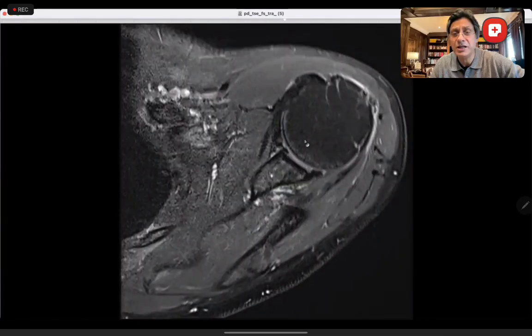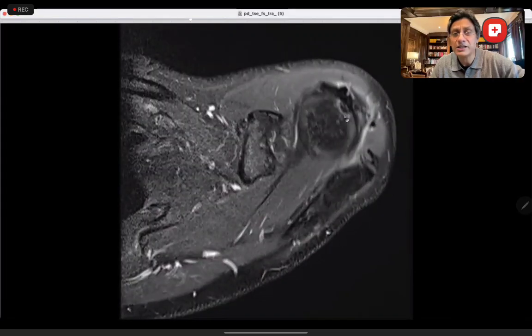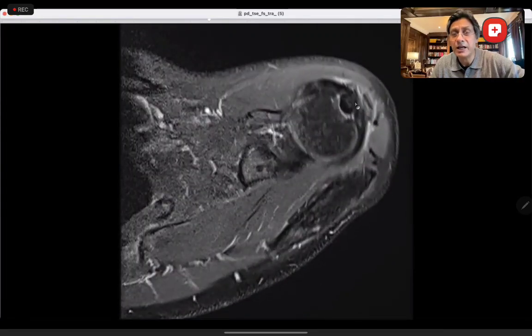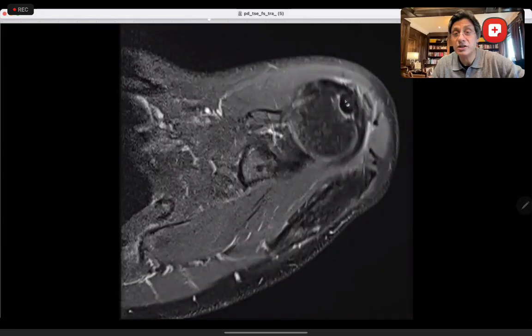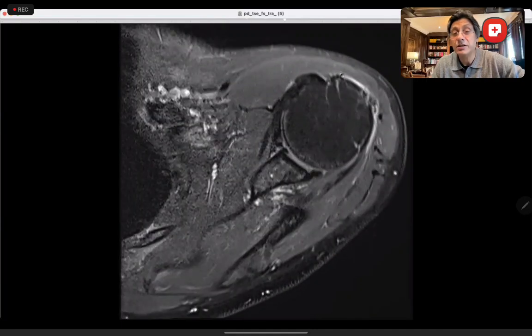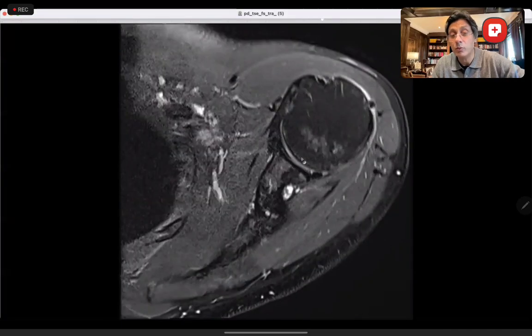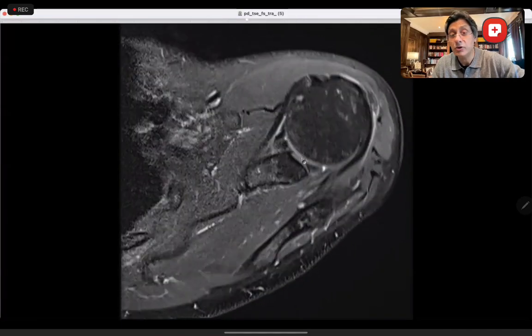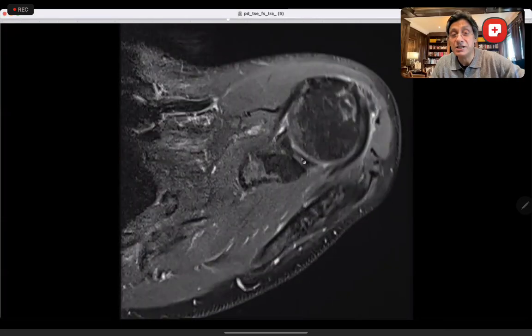The orientation is well maintained. How does the shape of the humeral head look like? So if you look at the top, nice and black, except for this flattened sort of black area. Remember, this is calcification which has gone into the bone. So it's eroded into the bone. So this is the only thing that we picked up. This is the calcification. These are calcific foci in the tendon. But otherwise, the things that we looked at look pretty unremarkable. So there's no glenohumeral wear and tear. There's no joint effusion. There's no capsulitis. There's no os acromiale. The visualized tendons look okay.